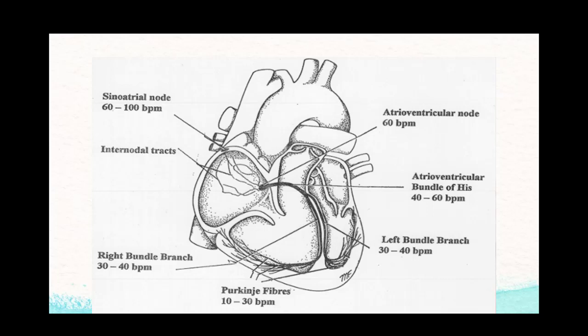As we go further down in the ventricles, if the rate is under 40 and is wide, anything coming from the ventricles is going to have a wide QRS greater than 0.12. Our normal QRS is 0.04 to 0.12. If our QRS is wide, then it's coming from the ventricles, okay? And that's going to be under 40.